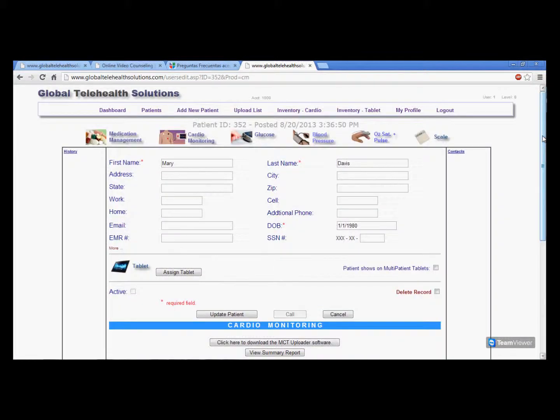Okay, let me now show you. Patient is gone. Patient is being monitored. A cardiac event is detected by the device. In 2 minutes time, that device will upload a 60-second strip to our server, and the doctor will receive the alert.